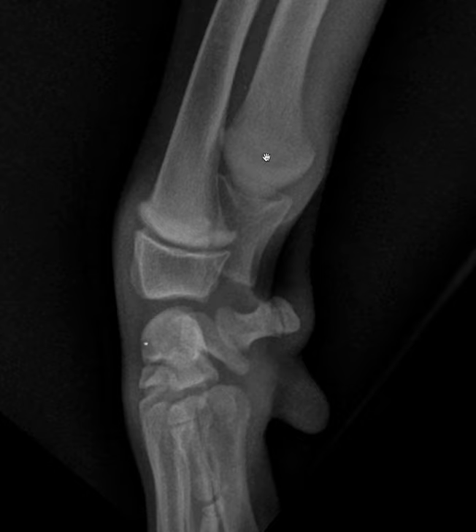The metaphyseal side is often a little bit more opaque. This is because of the active ossification that's happening here. So I look at the physis in terms of size, shape, opacity, epiphyseal and metaphyseal surface, which I trace with my eyes, or in this case with my mouse, and I look to see if there's any defects.